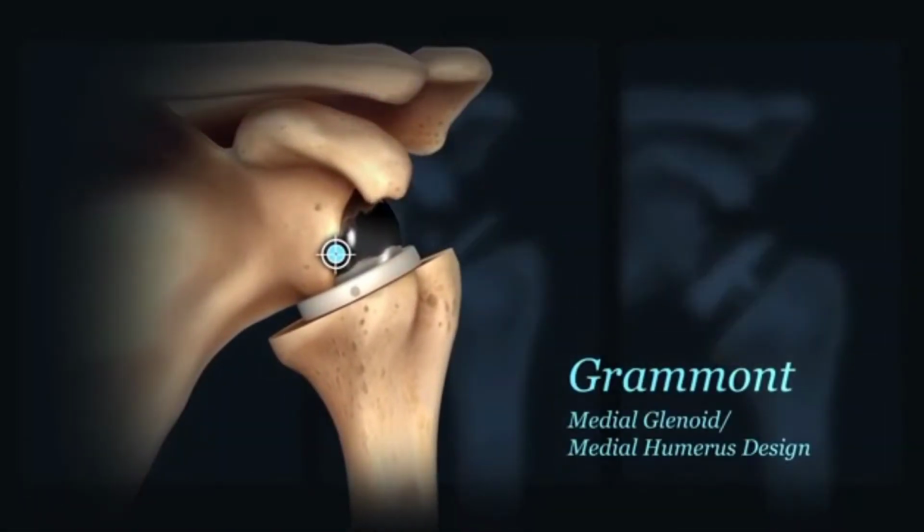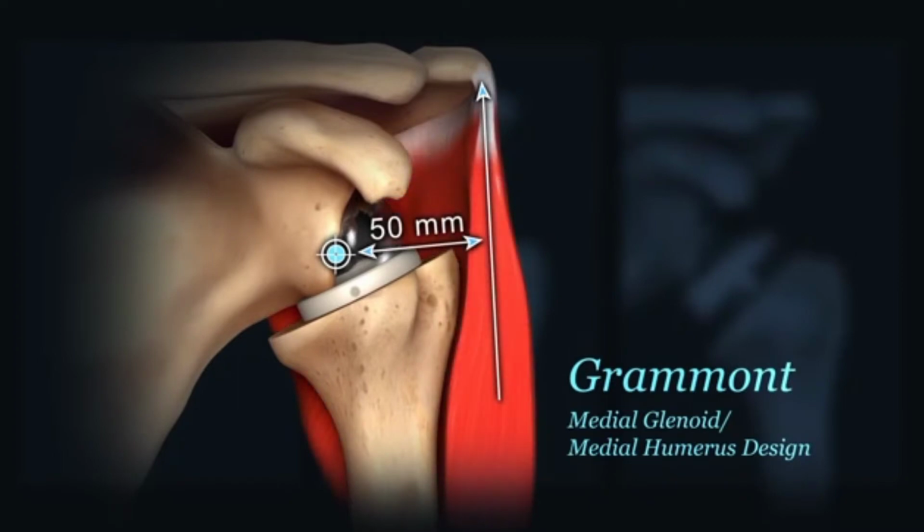The Grammont reverse shoulder glenosphere, whose thickness is 1/2 its diameter, medializes the center of rotation to the face of the glenoid to minimize the torque on the glenoid bone implant interface and increase the deltoid abductor moment arm lengths.